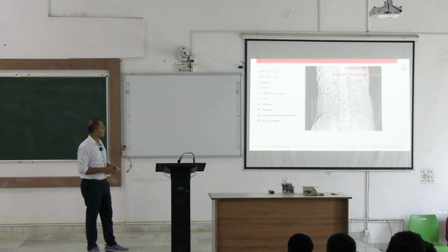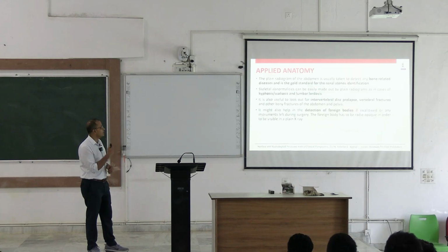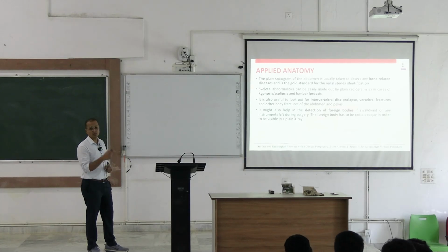So this is all about the X-ray that's commonly given. We call them plain X-ray. From this plain X-ray, what information can you get from it? You can get whether this particular bony shadow is diseased or not.